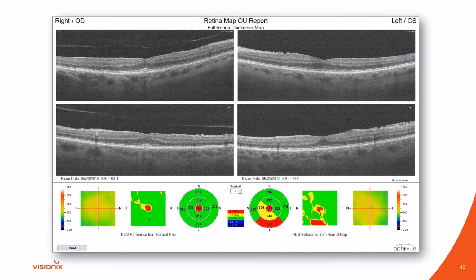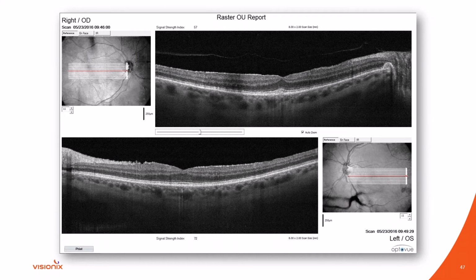There's no significant thickening of the retina. The photoreceptor integrity line looks relatively good. So I think most of us would say, hey, I could see this at 20/25, give or take a line either way, but yet she's 20/60 in the right eye. And that's why the retina specialist is considering an MRI to try to figure out, is there something neurologic going on?